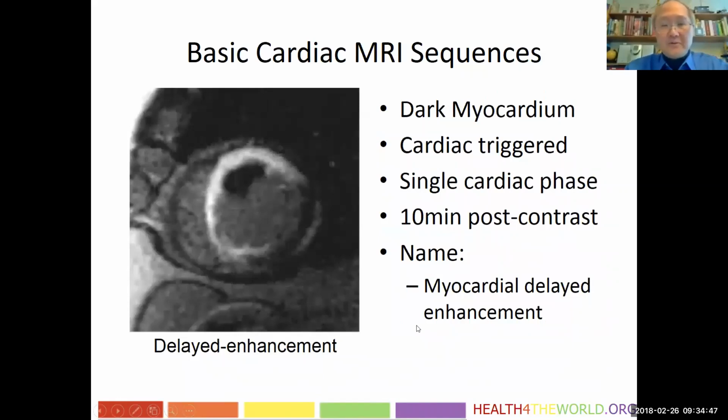Finally, we will talk about delay enhancement. Delay enhancement is a special technique where the myocardium itself is suppressed deliberately, so any abnormal signal in the myocardium will jump out bright. Here's an example of a patient with a left anterior descending artery infarct, pretty extensive. These infarcted areas now retain contrast and look very bright.